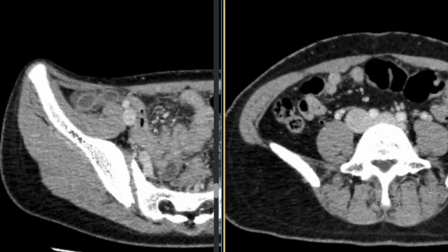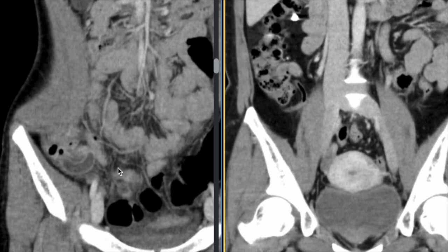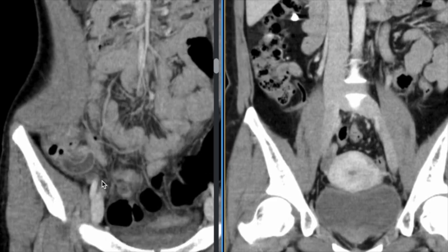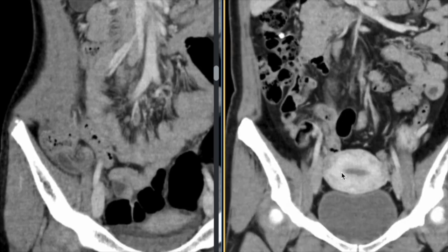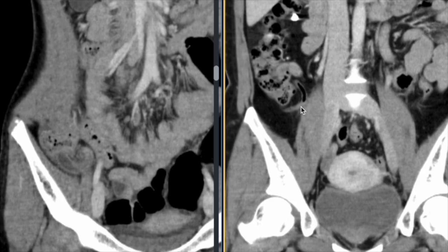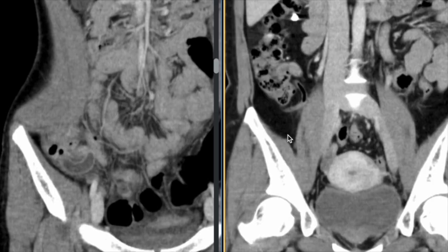Now check the two cases in the coronal plane, view from the front. On the appendicitis image, the enlarged appendix is easy to see, and you can clearly trace its course. In the normal image, the appendix is this slender structure here. Because it hasn't enlarged, it's a bit harder to spot, but that's the appendix. Comparing them side by side makes it clear how dramatically the inflamed appendix swells up.